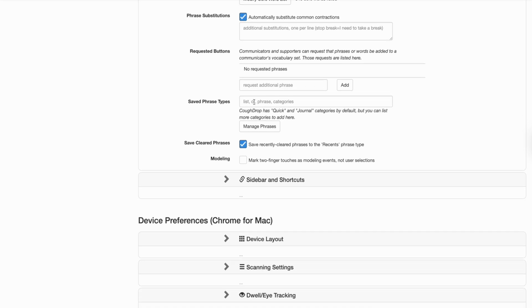And then you can also save your phrases. We will go through this a little bit more when we show you the board. But I thought that would be kind of fun. Like if you have something you like at a restaurant, you go to this restaurant all the time, you could save your order. Like, I would like a double cheeseburger and a small fry with a small Coke, please. And then you wouldn't have to type all of that out. You could just go to your saved phrases and get up to the window and push the button, and there it is right there for you.